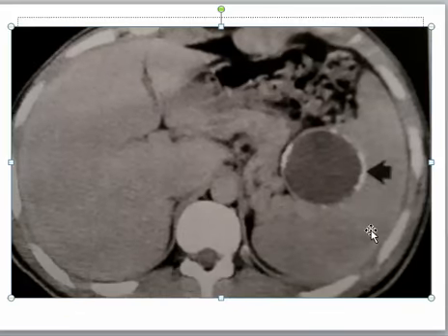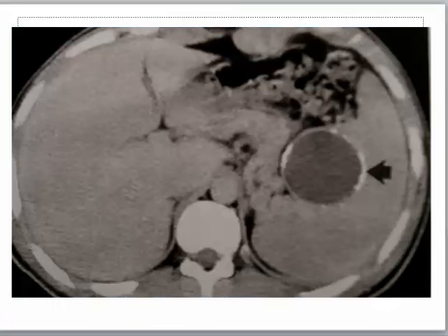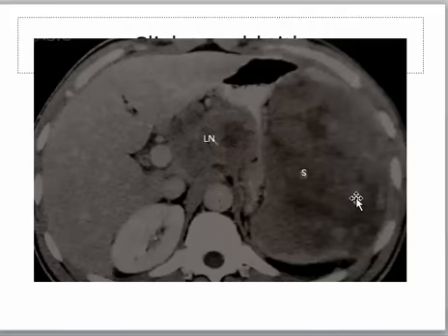Post-traumatic splenic cyst with calcification, but this appearance again could be due to aneurysm of the splenic artery. Microabscesses of the pancreas or of the spleen can appear like this. Infiltrations due to lymphoma can appear the same. Lymphoma of the spleen, lymphoma of the retroperitoneal lymph nodes.